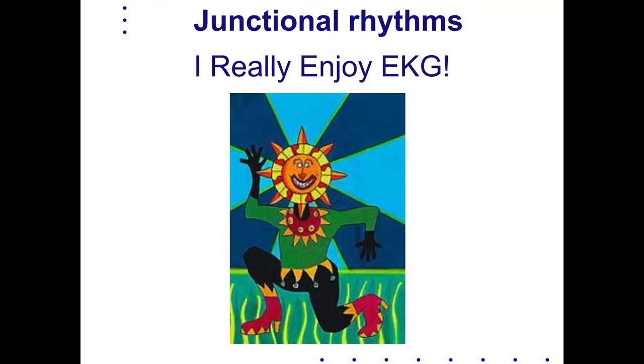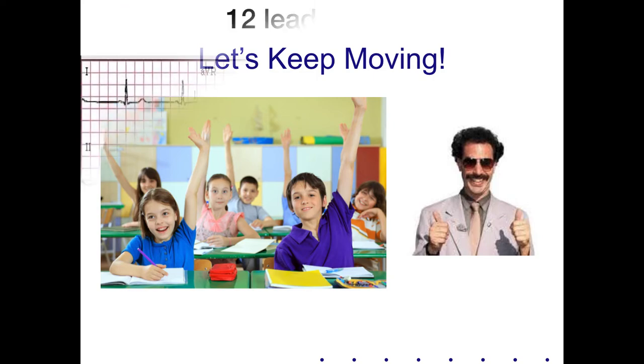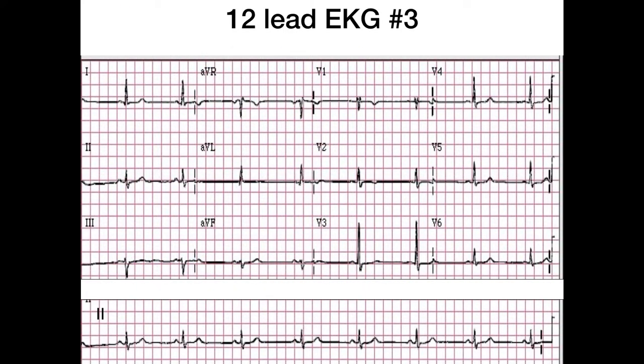Welcome back, class. We're going to go straight into junctional rhythms. I know we're super enjoying EKG, so let's keep it moving. Oh, yeah. All right. Here we go. Let's do a 12 lead just as a refresher, just for fun.